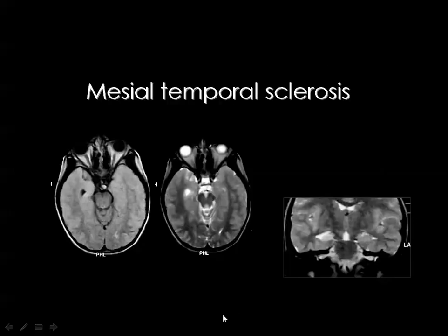Then one of the important issues here, especially in the pediatric age group, is to locate the site of the medial temporal structures, particularly the hippocampus and the amygdala. We have reached the tentorial hiatus, and this is the site of the midbrain, surrounded by the quadrigeminal cistern from posterior, the interpeduncular cistern from anterior, and finally this is the suprasellar cistern.